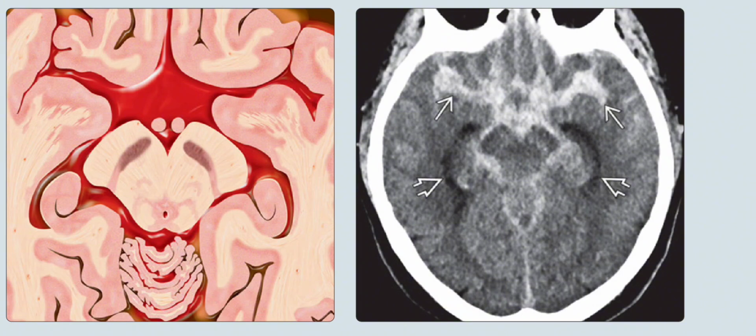Right is the axial non-enhanced CT scan in a 63-year-old man who was found down in a parking lot, and it shows the diffuse subarachnoid hemorrhage throughout the basal cisterns. Note the enlargement of both temporal horns of the lateral ventricles, consistent with early extraventricular obstructive hydrocephalus.